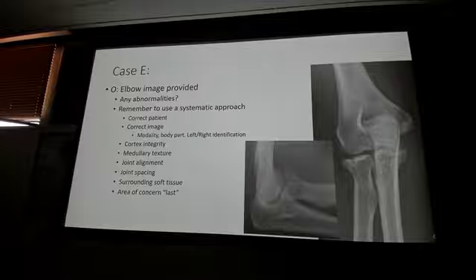So you don't need to find it on this x-ray, which means on the test, if you see a clear radial head fracture, don't spend additional time looking for a posterior fat pad because you found the abnormality. The posterior fat pad sign is designed for those elbow injuries that you don't see anything wrong on the x-ray and you're looking to confirm by having an absence of it, right? Or if it's there, then you know that there's one.